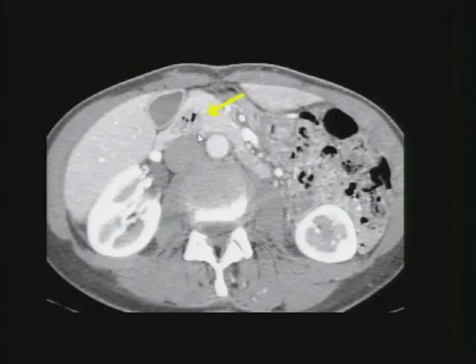What you see on upper GI is a classic short segment narrowing of the second duodenum. You can see it's fairly symmetrical, and this is the cause. Here's positive contrast within the second duodenum. Here's the band of pancreatic tissue encircling the duodenum. Now, this is an easy case, right, where we have air bubbles within the second duodenum that nicely outlines it.